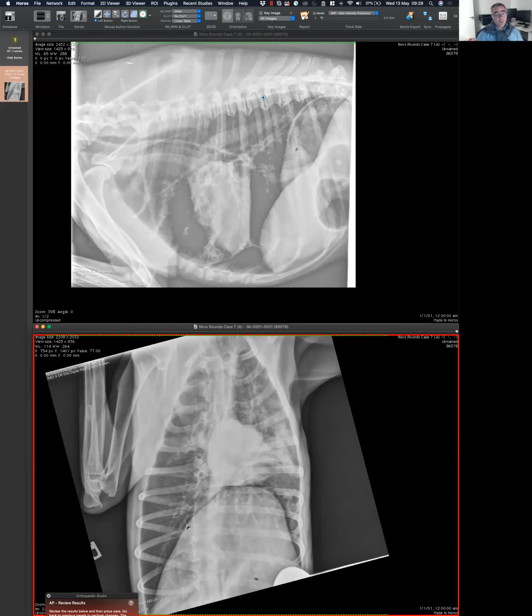So because it's rotated, now we don't know if that heart moving into the left hemithorax is real, which will be extremely important in this radiograph. Make sense? Because if there is a shifting of the heart and we have that change in the lung, we may be thinking about atelectasis. If there is no shift of the heart, then we are thinking about something like pneumonia. So that piece of information is very important in this case, and probably we have no certainty because of another technical issue. So we are dealing with two technical issues here that are making our life very complicated, and it would be so simple not to have them. The reason why I enjoy this is because now you see by yourself how something that may take one more minute to do right may have a very big effect at the end. You basically rely on the perfect positioning and perfect exposure, because otherwise the limitations are big.